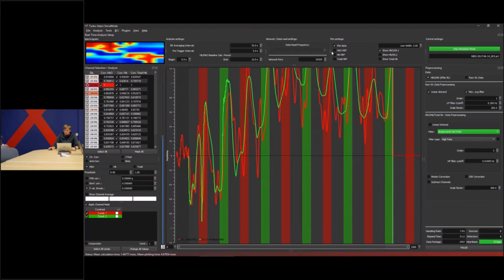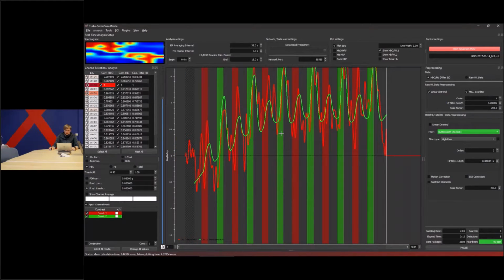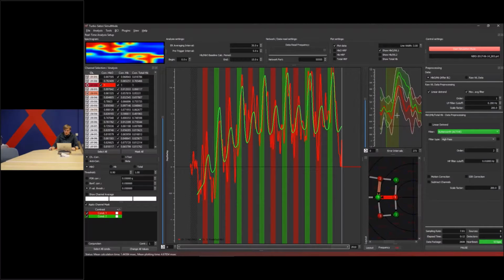Okay, let's run through. Yes, and now you see that the predicted signal here, the green time course, represents what the model estimated. And you can see here for this channel, which is this part, you can clearly see that there is a higher activity or a higher peak for the conditions for the right tapping. And this is also shown here for the model.